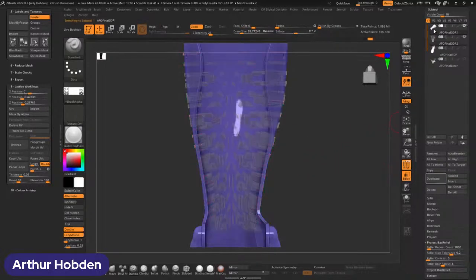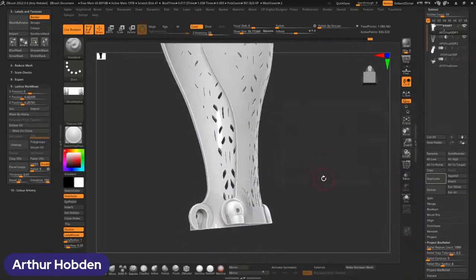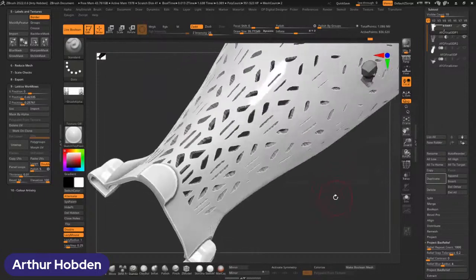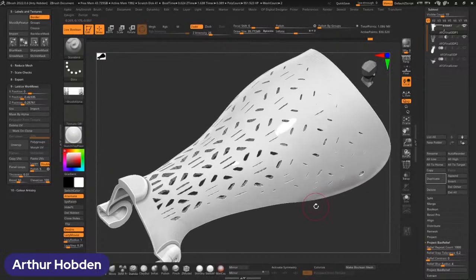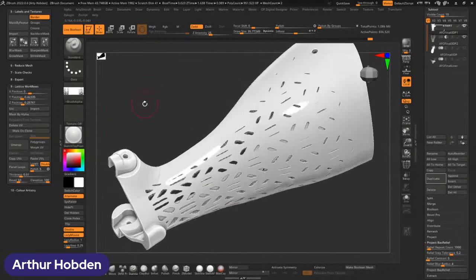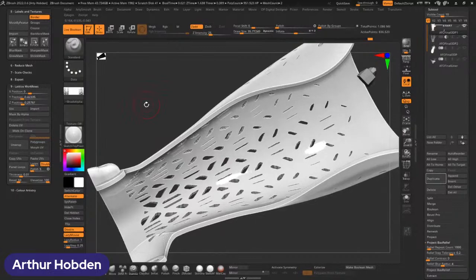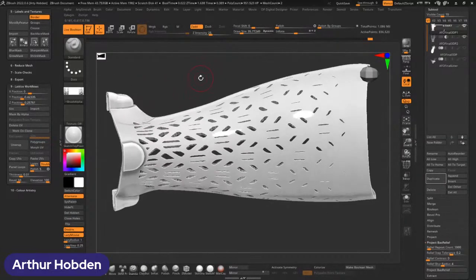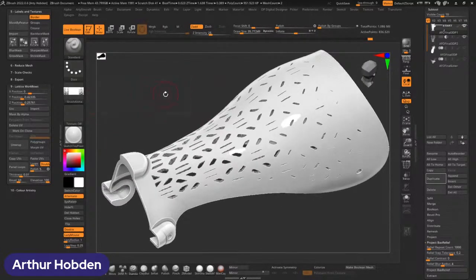And then using a weird way of booleaning parts together, visible and structured in subtools, making sure all these are off, we can hit live boolean. And just like that, we can get from a 2D texture a cut through. Nice. So really exciting stuff. Again, you can map this all on a 2D image, and you can find these images online. And so it's that easy to go and make these devices and then create prints from them. So that's a really cool feature for ZBrush.